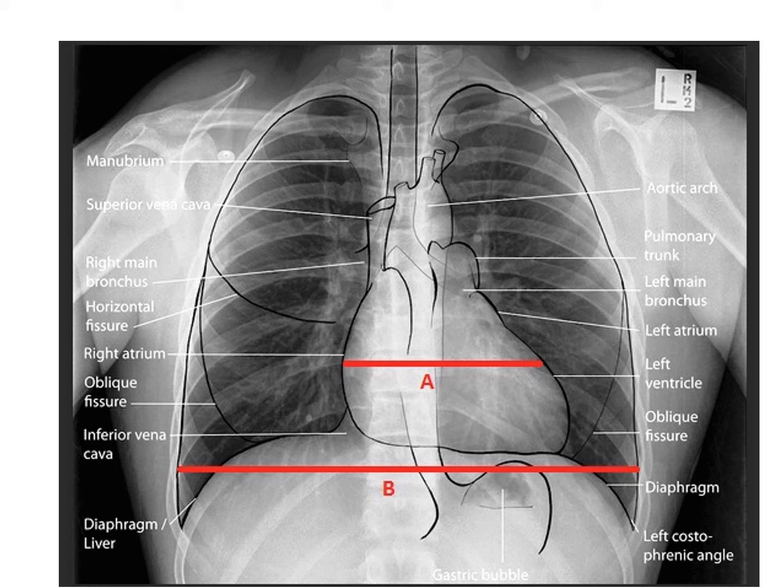The second thing to think about is film exposure. This is basically what you can see within the image itself. You should be able to see the first 10 ribs posteriorly on an inspiratory film. You can differentiate items on a chest x-ray due to the different densities of material. Black on an x-ray is air, dark grey is fat, light grey is soft tissue, off-white is usually bone, and bright white is metal.